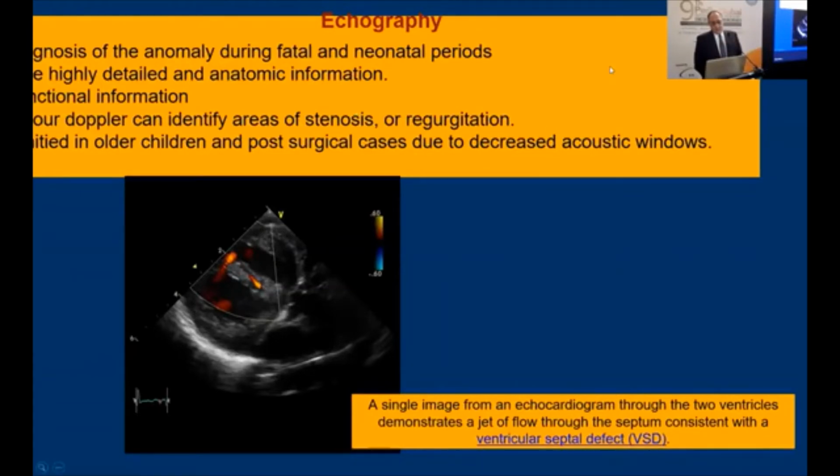But this modality is limited in post-surgical cases and also in older children due to decreased acoustic windows. Here is an example for ventricular septal defect.